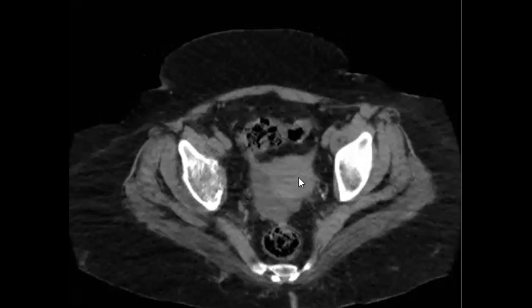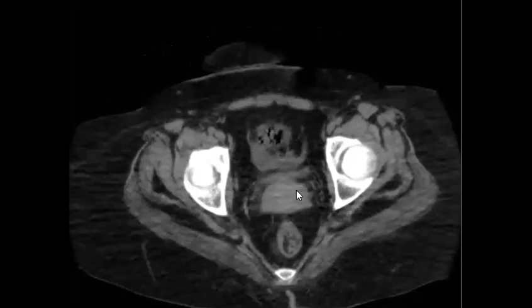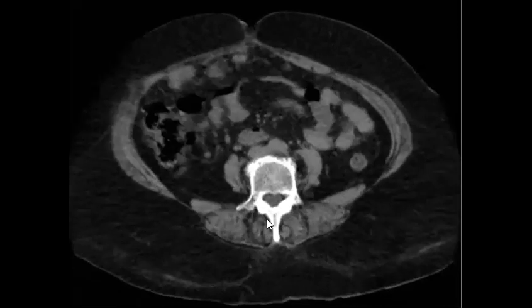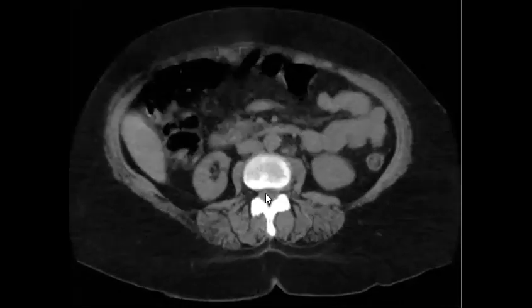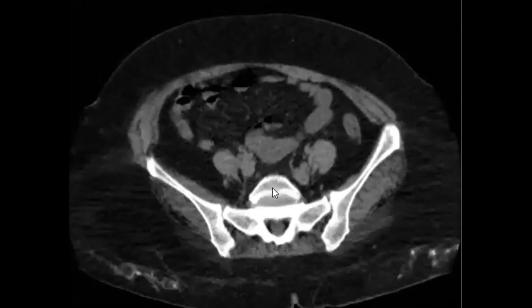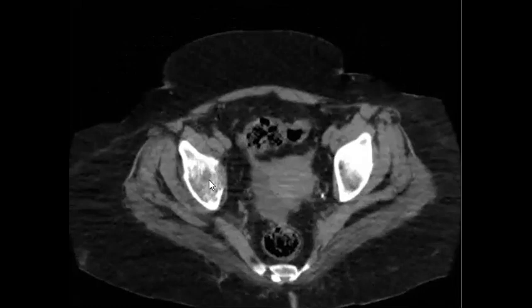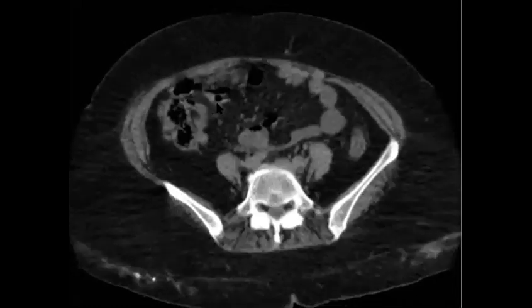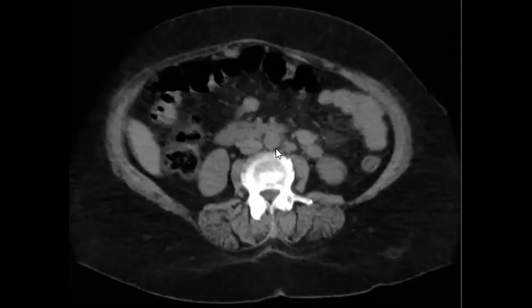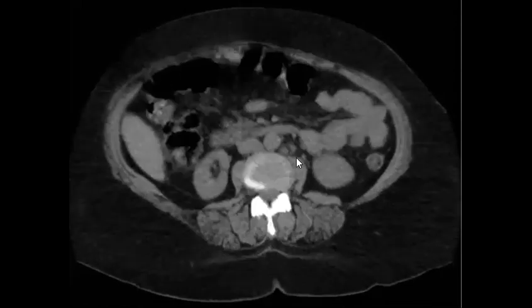That's one question. What is the workup from a radiological point of view? For the clinician, he will check everything and maybe request something. But if you just have this image and you are surprised with this mass and this soft tissue lesion, I wait for you to mention that there are also some para-aortic lymph nodes that don't look very well.